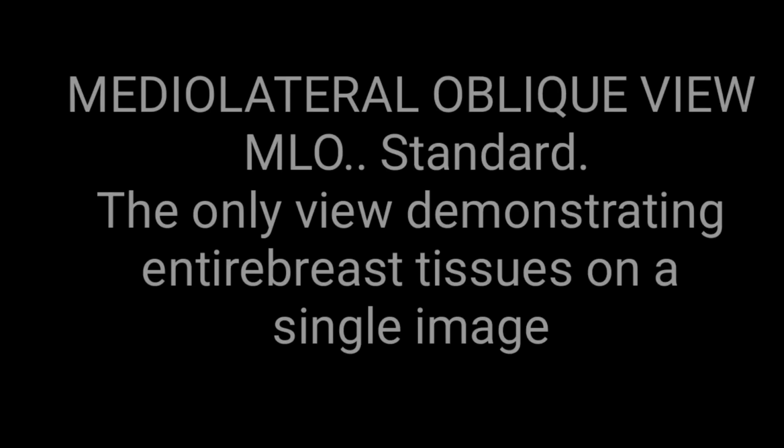The integrity of the mediolateral oblique view can be confirmed, whether it is well positioned or not. It would be well positioned if the inframammary angle is demonstrated, so you should be able to see the inframammary angle, the first point. The second point is that the nipple would be in profile. If the nipple is in profile, it means the MLO view is correct, and the nipple is positioned at the level of the lower border of the pectoralis major muscle.